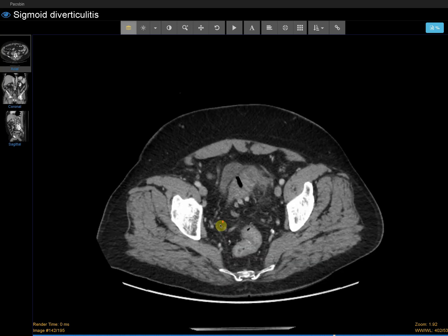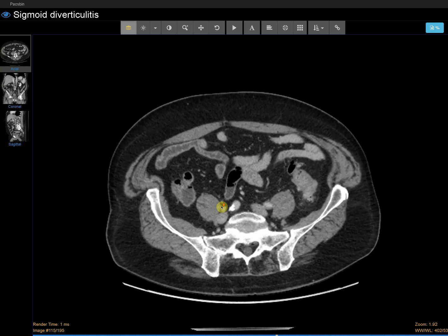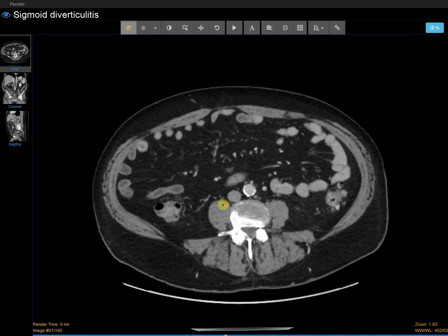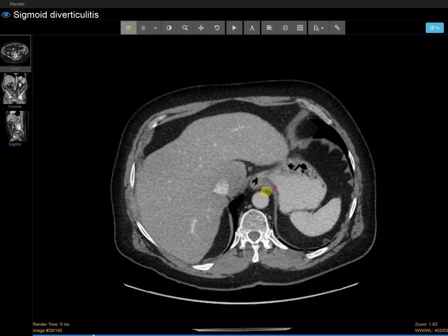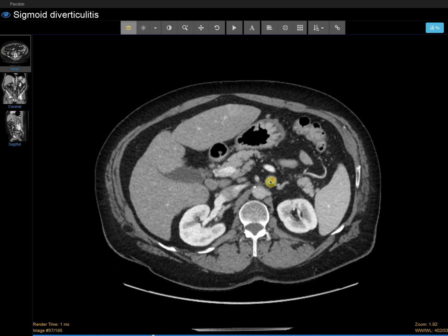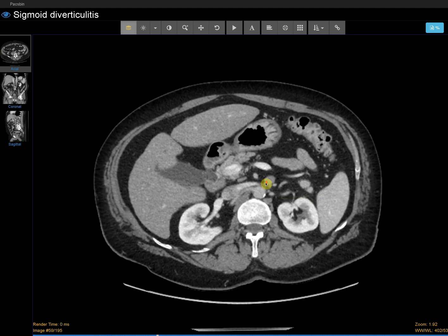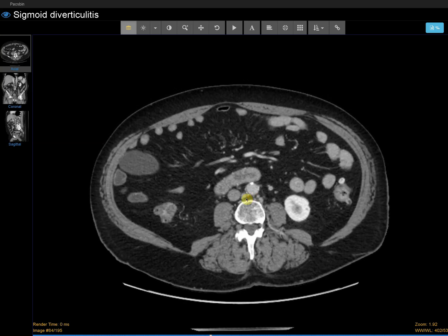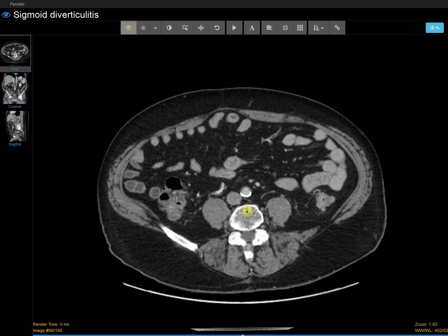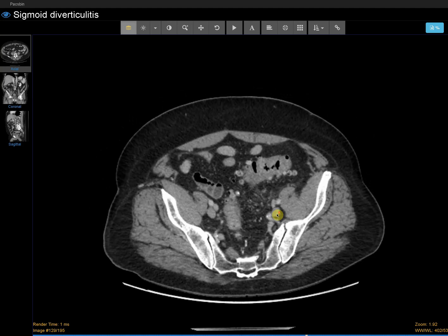The other ureter, let's follow it back again. It's not dilated, so I think the probability of this ureter having a stone is really low, but we'll follow it up and there's nothing. And we can check for lymphadenopathy as well. There's a bunch of prominent lymph nodes. There's one right here. There's a few right here. It's just scattered, prominent, nothing that I would call way abnormal.